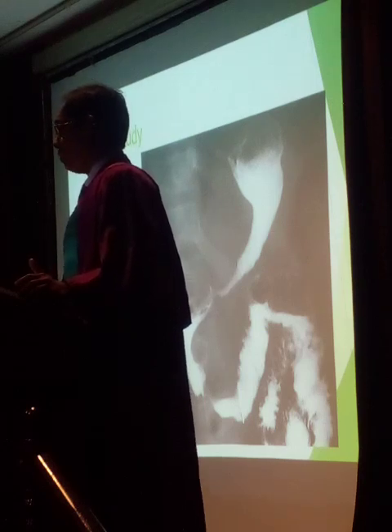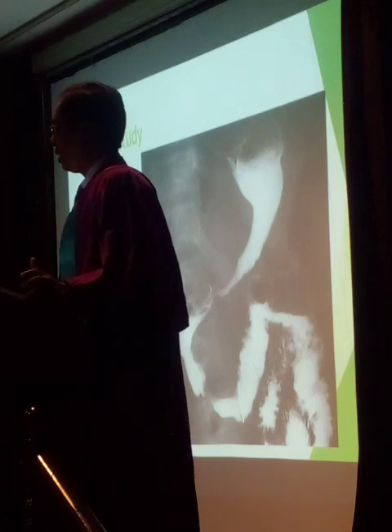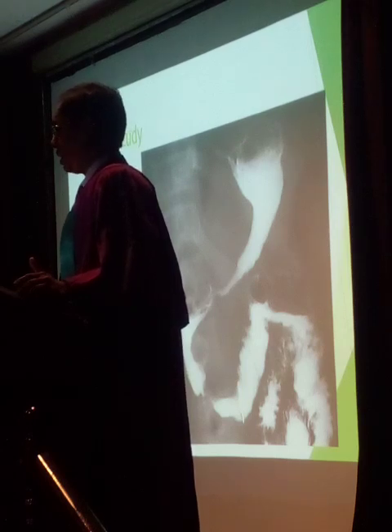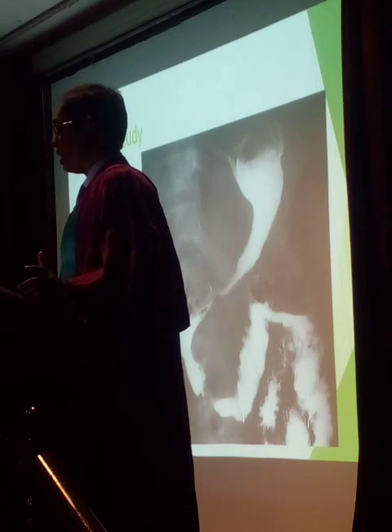This second part of the duodenum will give a bulge into the duodenum with a smooth margin or irregular margin. If it is a smooth margin, it may be a benign pathology most of the time. But if it is irregular or ulcerated in appearance with shouldered, sharp borders, then we have to think about pancreatic carcinoma. With the history and other findings, we can say there may be a pancreatic carcinoma which has invaded into the duodenal wall. That's why we get this irregular appearance and proximal obstruction.